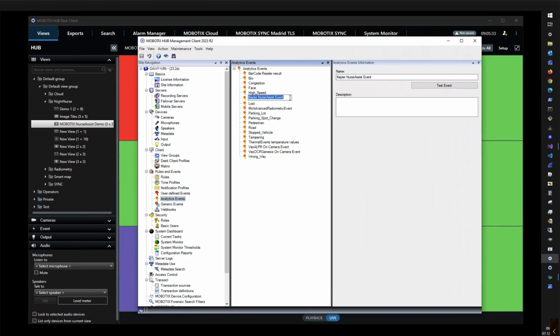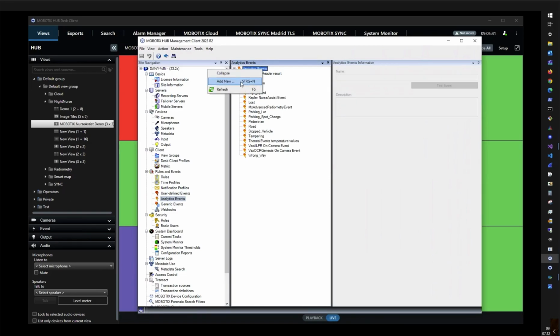There we need to go to the sidebar, go to Rules and Events, select Analytics Events and create a new analytic event. Here it is very important that we name that new event exactly as shown in this video. That means it's Kepler space NurseAssist space event.